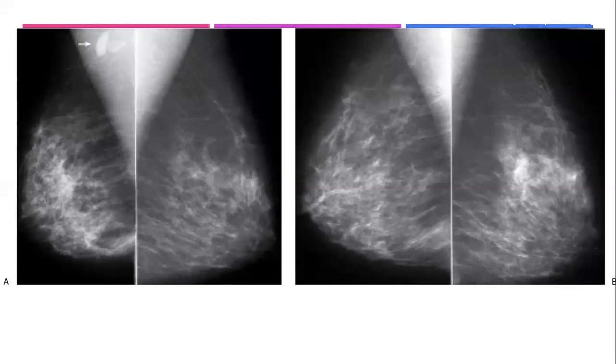What is the abnormality in this? This is not my case. All the previous cases are our cases. The majority are my cases and a few are from our institutions, from the system. But this case is from the literature, because I could not find an example for this pitfall. That is why I brought it for you from the literature.